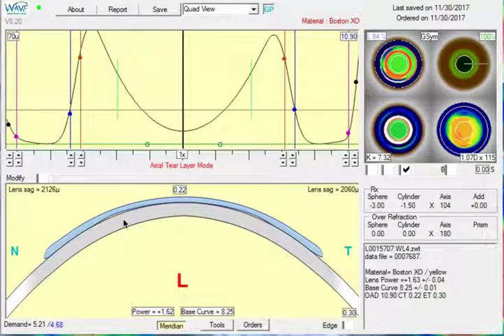In this orthokeratology case, we have a patient with against-the-rule cylinder that remains persistently in refraction even after a few lens design changes. So in this case, what I would probably do is go to a toric treatment zone. And this is against the rule, so we're going to shorten the treatment zone in the horizontal meridian and then also build in a higher topodemand in that meridian.